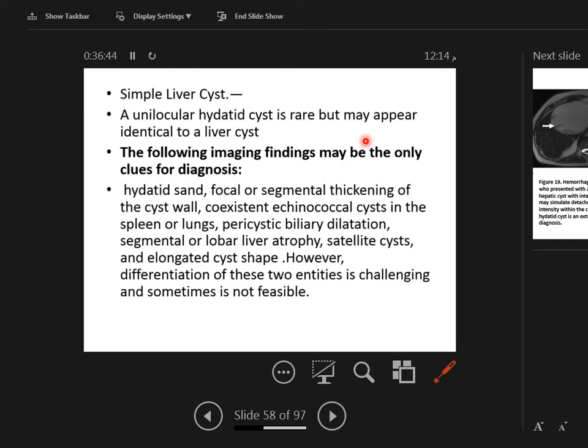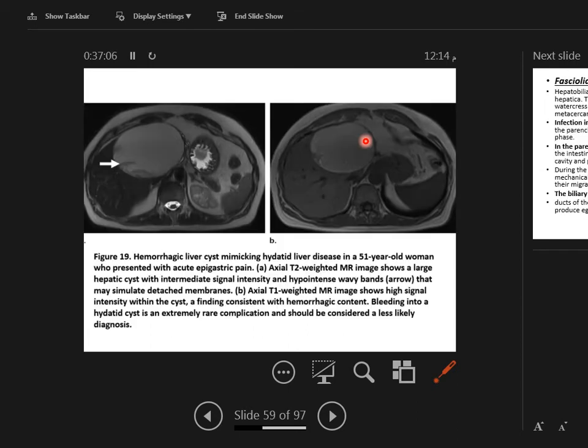The role of diffusion is not as measurable in differentiating simple cyst. Usually the cysts that are difficult to differentiate are the small hydatid cysts, of super small size usually. The small hydatid cysts are usually unilocular. Okay? Because the bigger the hydatid cyst, the more likely they will show the typical signs. So, for small cysts in the liver, it's very useless to suggest doing MRI just to see the diffusion, to know whether this is simple or hydatid.